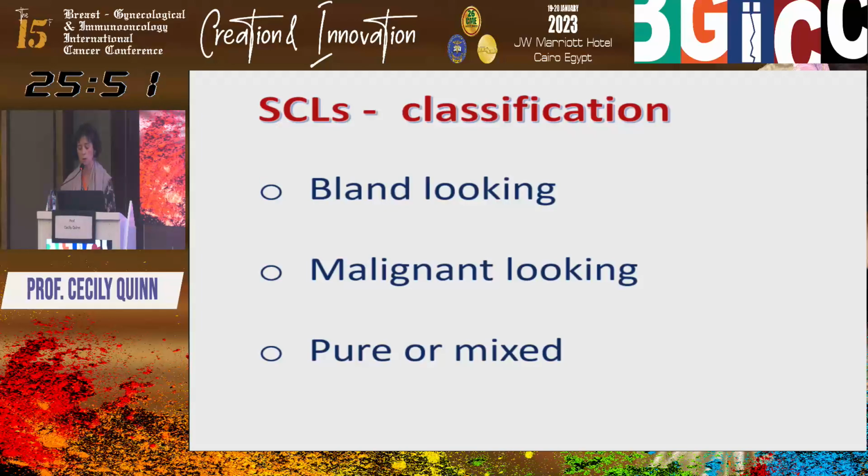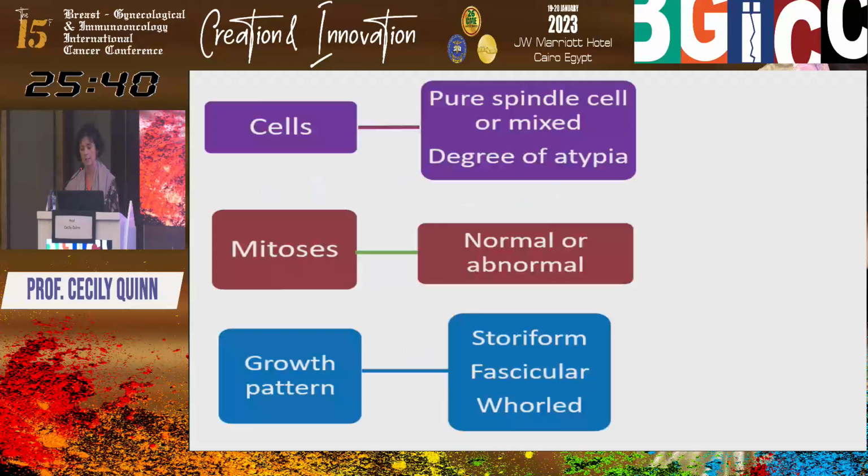Clearly, of course, we also divide these lesions into pure or mixed. Diagnostically, the main difficulty is with the pure lesions. If we have a mixed lesion, often the diagnosis is more clear at the outset.